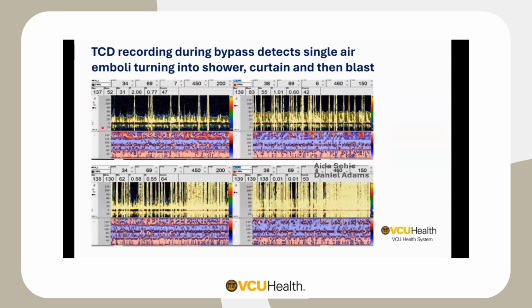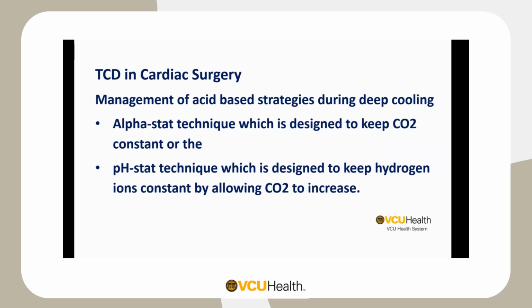This is another case, where single emboli gradually increased to shower, to curtain, to blast. Now, if this is not stopped, it's going to end up in neurological deficit. TCD is helpful in management of acid-base strategies during deep cooling.